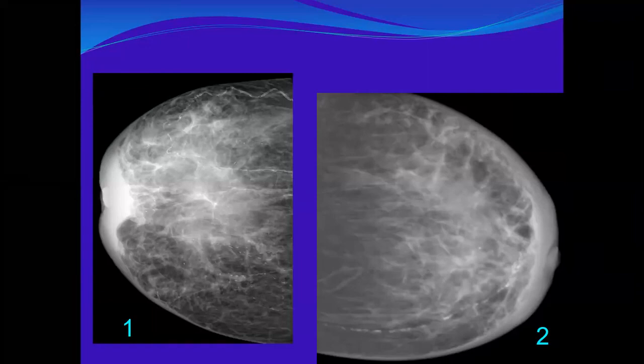There is asymmetry. There is a central or global asymmetrical density in the breast. Global asymmetrical, and nipple inversion. Wait. Global asymmetrical density. We said no more use of density as a descriptor in the asymmetry. This was earlier, historical.